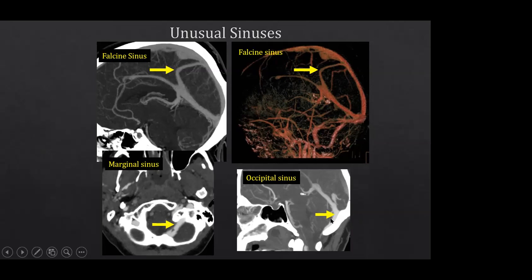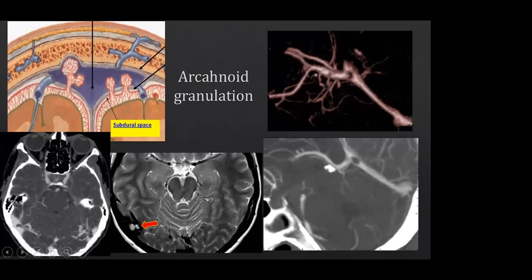If there is a midline occipital sinus, it typically will drain. So now we are at the level of the foramen magnum, round about this level. This occipital sinus then drains along the margins of the foramen magnum via this venous structure called the marginal sinus, eventually into the sigmoid sinus or jugular vein. So this is the marginal sinus. Very important to identify these sinuses, especially for surgeries around the foramen magnum, because inadvertent trauma can result in significant blood loss in these situations.